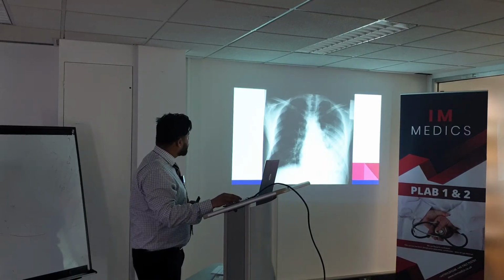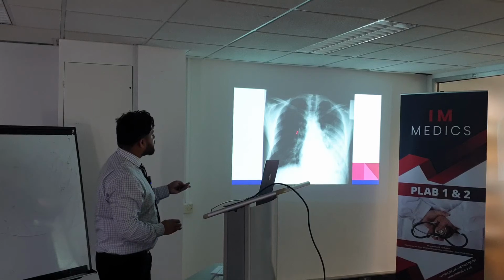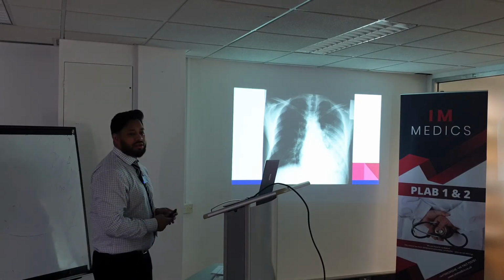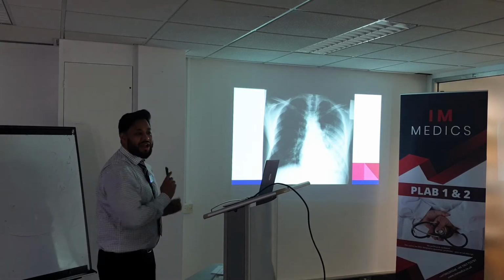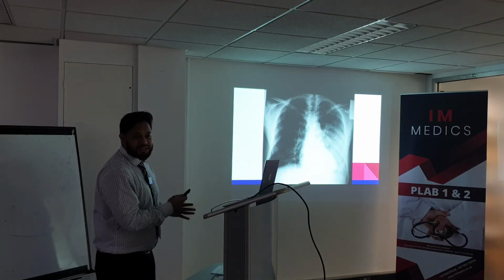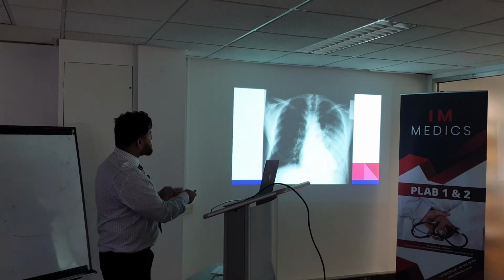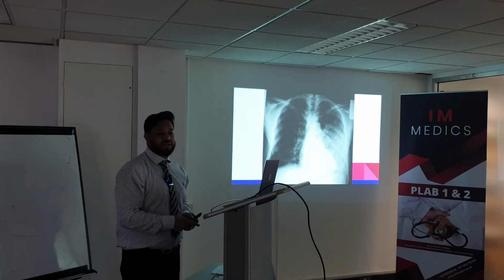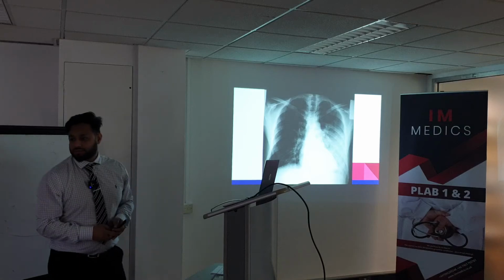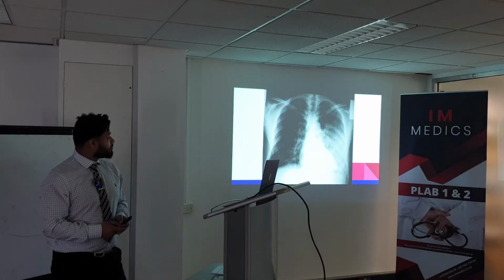that might be helpful. Okay, so this one, what can you see? What's happening here and what's happening there? Too much air over there. Too much air over there. Now it makes sense, doesn't it? Too much air and too much liquid there. So there is some kind of pathology here. Yeah? So what was this slide that he mentioned earlier? What was it? Do you remember, guys? It's a straight line in pneumothorax because there's the air.